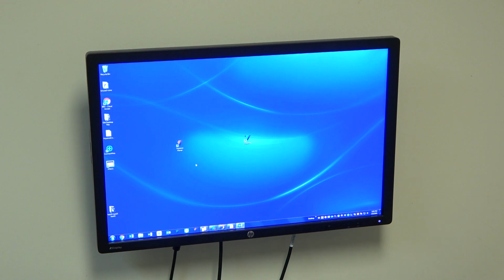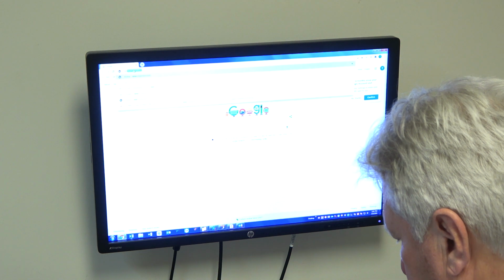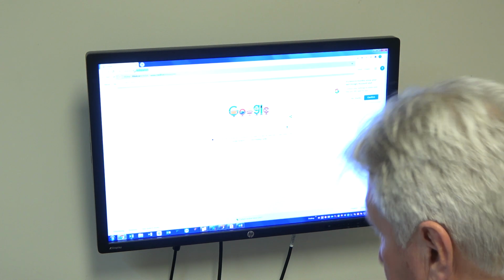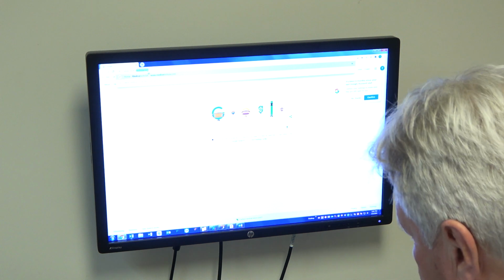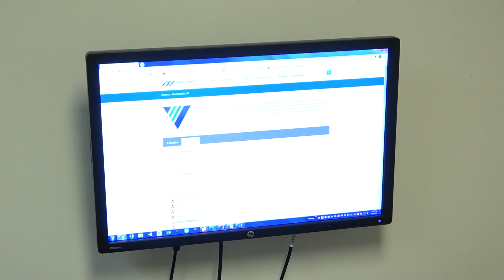The other thing is that Voyance does put their latest version software on their website. It's a very easy thing to download their software right from their website. So from the acquisition computer, for instance, you would just launch your browser. Their web address is www.medicatech.usa.com. When you go to that website, you would just go to Voyance, and then latest releases.